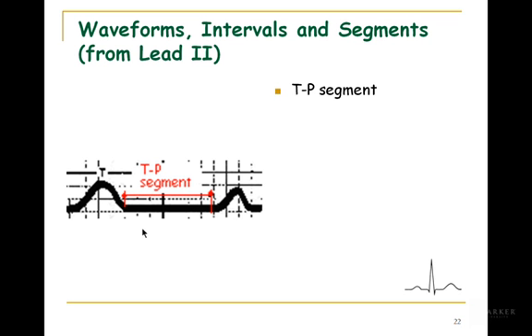We'll briefly go over some T wave abnormalities, but it's not supposed to be more than 5 millimeters or 0.5 millivolts. It's upright in most of your leads. If it's inverted, one of the things that may cause the T wave to invert is if repolarization was slow. So it's one thing that could cause an inverted T wave.